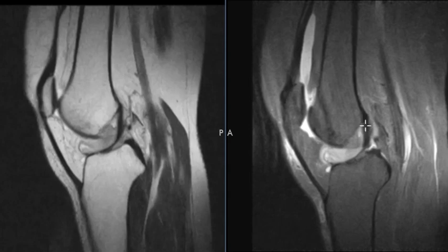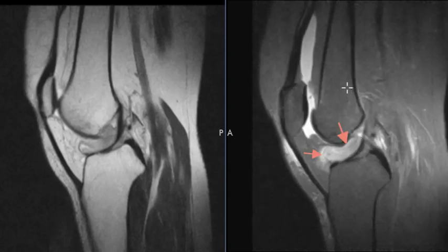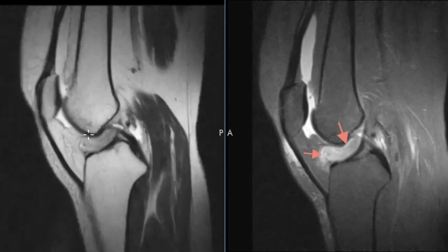And this is the anterior cruciate ligament. The ACL comes down from the back of the femur here to the front of the tibia. And we see instead of being straight like the ACL should be, the ACL should go perfectly straight, we see it bowed back significantly because of mass effect by this synovial process.